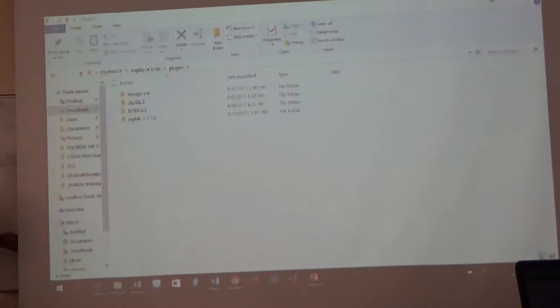I'll just write this again over. Awesome. Don't go forward. Okay, awesome. Don't do anything more than what we talked about. Just leave this alone. Just do exactly what we talked about. So just this. Perfect. Everybody good? Ladies in the back?